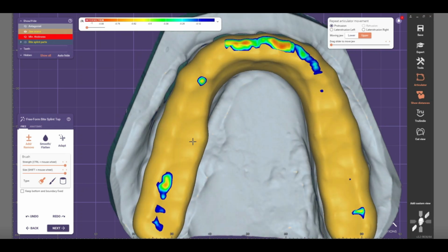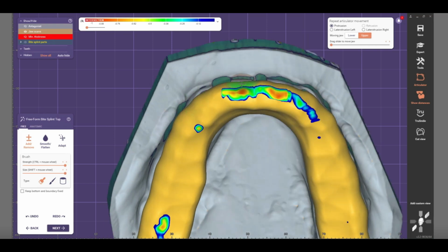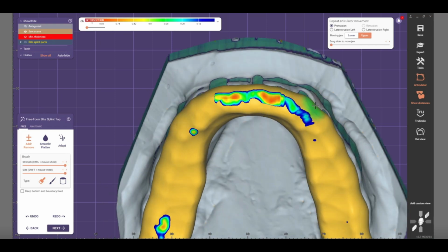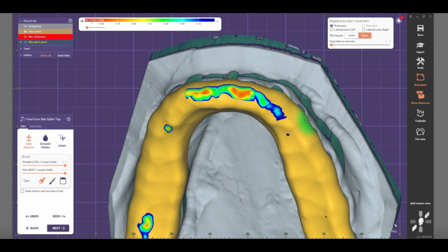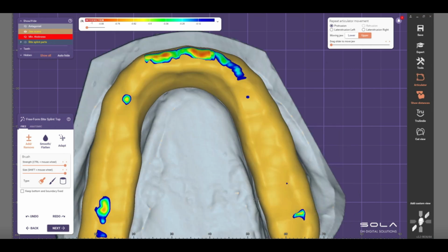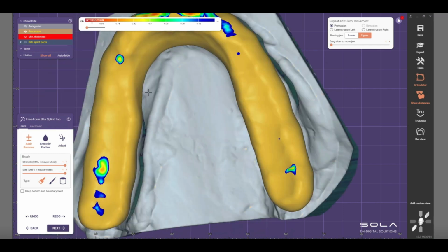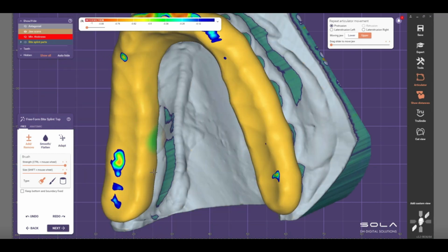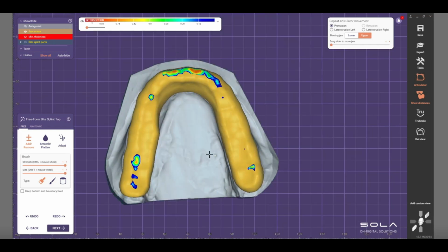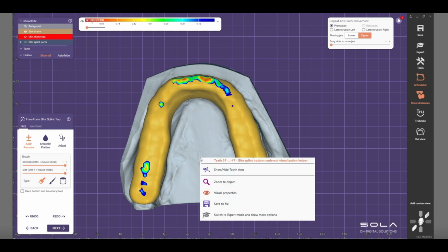So your occlusal surface, and I will keep on adding, to make sure it's as straight as possible, no kinks, no scalloping. Make sure the area is right there. Once you're happy with it, I would go to the next stage, which will be adding maximum strength.